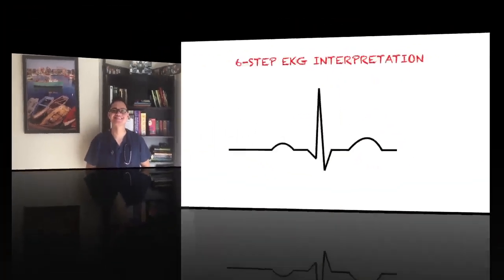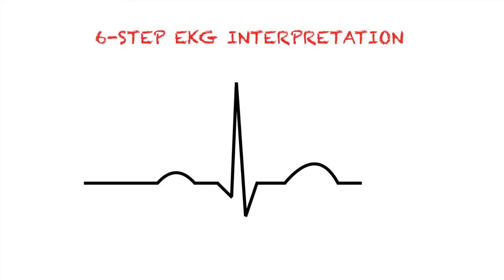So today we're going to talk about the easiest way to do your EKG interpretation. If you're a nursing student or a new nurse who wants to do your EKG faster, stick around. This video is for you. Alright guys, this is the 6-step EKG interpretation.